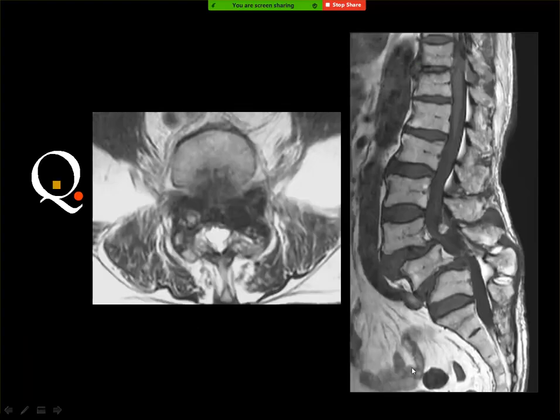Diagnostic possibilities have been repeated many times, and they include number one, meningioma, neurofibroma, schwannoma. If there is a non-primary malignancy, consider metastasis. Then the next is the filum terminale or the filum ependymoma. And what do you think of this?